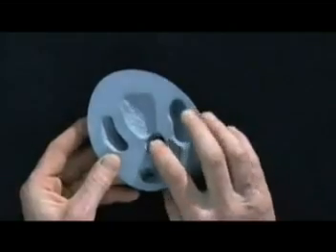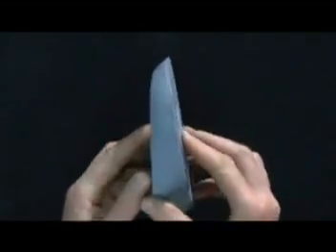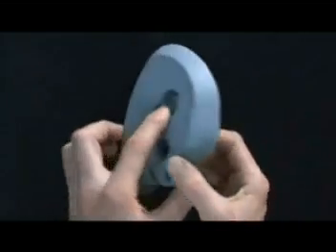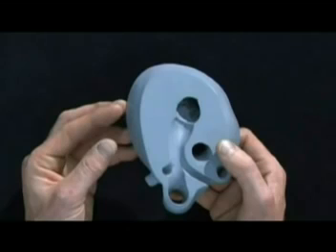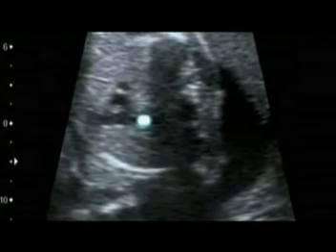If you pick up this slice and just look at the relationship of the aortic and pulmonary valves, you can see just how close they are to each other. The aorta running more or less horizontally across the chest towards the right side, the pulmonary outflow running more or less straight from front to back, running straight into the ductus arteriosus. Pulmonary valve running into pulmonary outflow and then on into the ductus arteriosus.